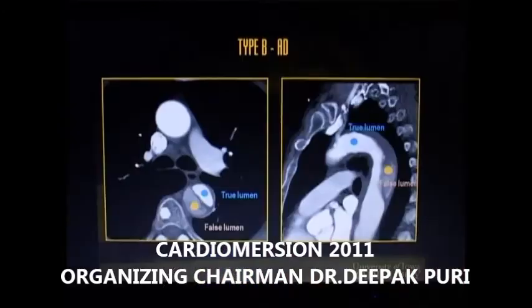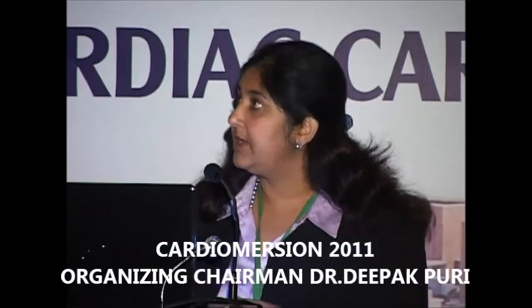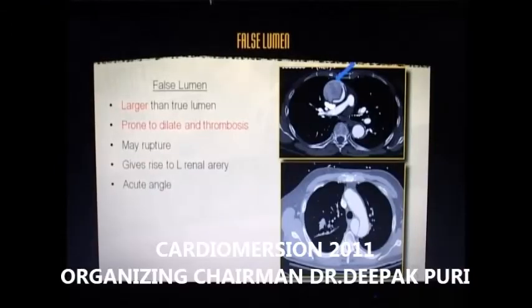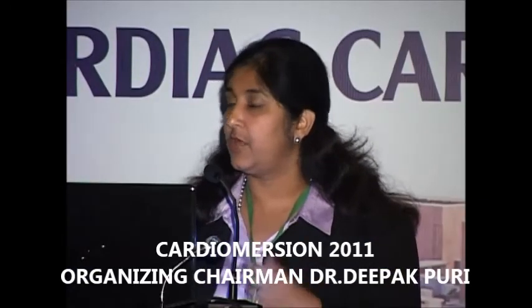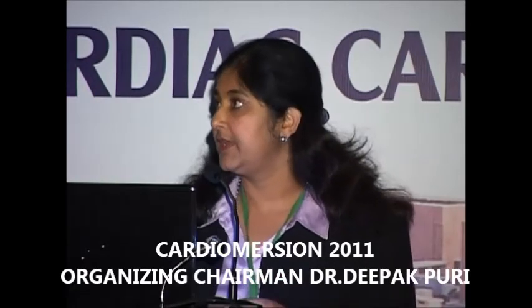This is an example of type B aortic dissection demonstrating the true and false lumens, as you can see. The false lumen is the larger lumen, and it is more prone to thrombosis, and this is the lumen which usually enlarges and leads to aortic rupture. So it's a good idea to keep an eye on the false lumen, especially in type B aortic dissections if we are following up the patient.